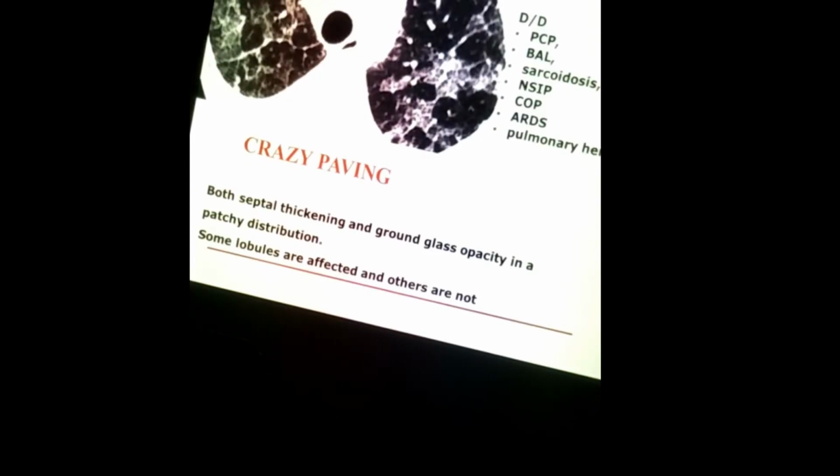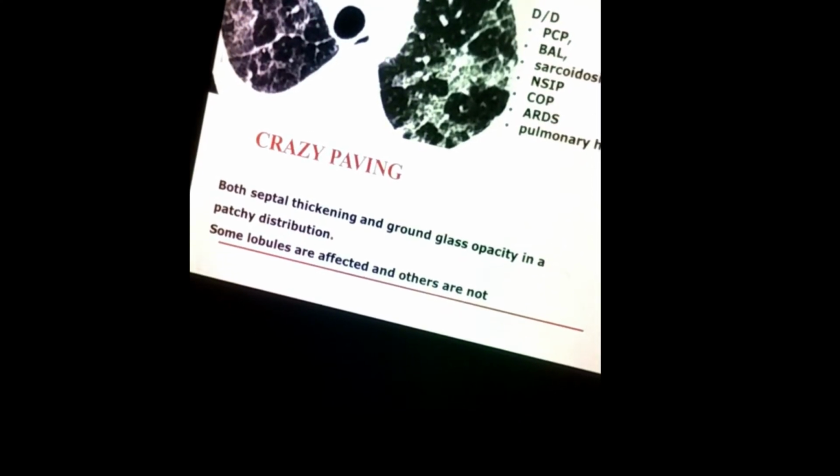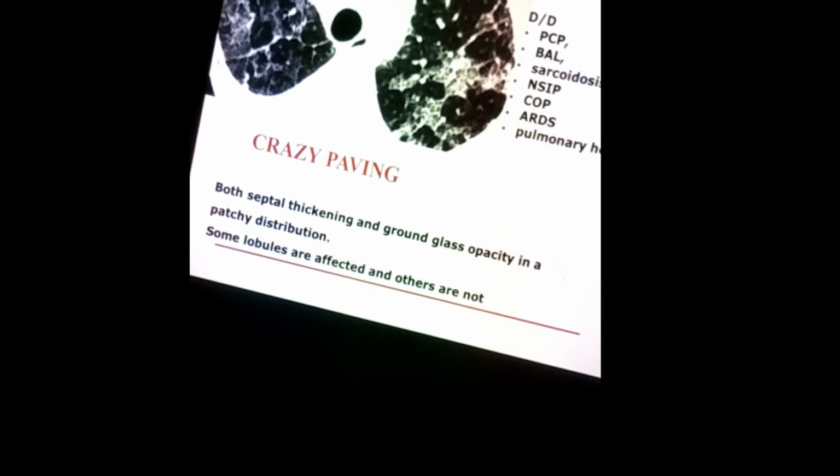So this slide shows that this patient may have sarcoidosis. Okay. What you see here, you see that there are interseptal thickenings, but predominantly there is ground glass haze. Here you see that the septas are thickening smoothly, that this is the septal thickening, and this is smooth pattern associated with ground glass haze.